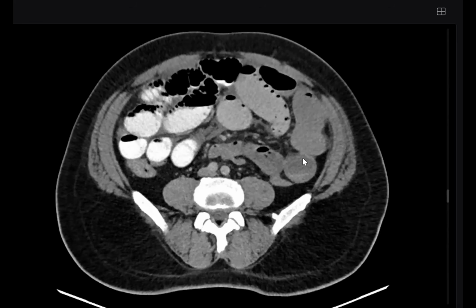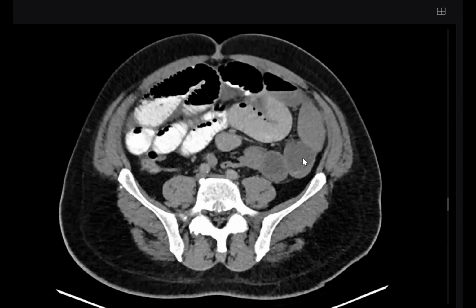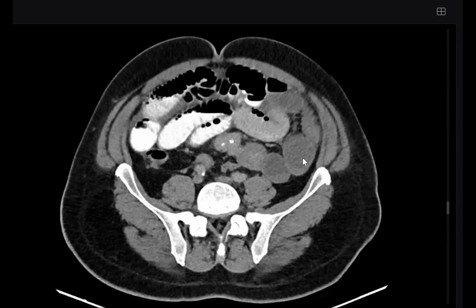Excellent. Go down. Good. Sir, I don't appreciate any. Show me the calcification. Sir, this is very good. Yes, sir. So this is concerning for a carcinoid kind of thing, sir, but I don't appreciate any desmoplastic reaction, which might be causing the retraction.